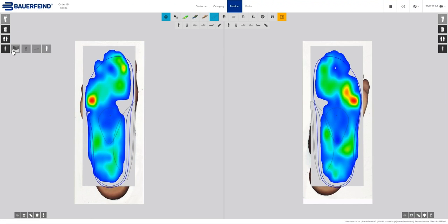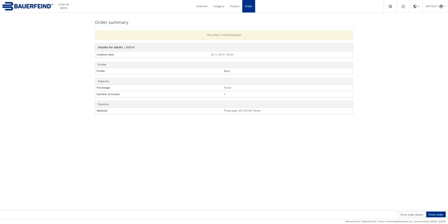Once you have completed modeling, don't forget to click on the floppy disk icon at the top of the screen to save your input. We recommend you keep saving during the editing process of your modeling to prevent data loss. Then continue by clicking on the yellow Save and Next button at the top of the screen. The Continue function is linked with automatic saving to prevent accidental data loss.